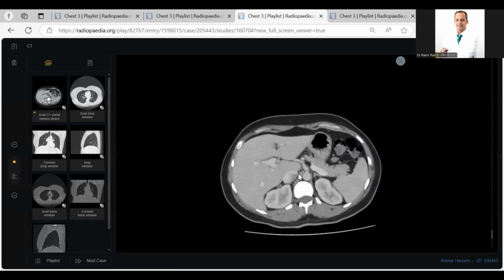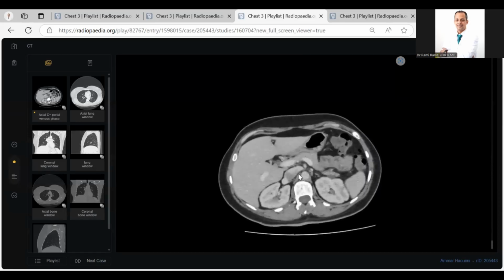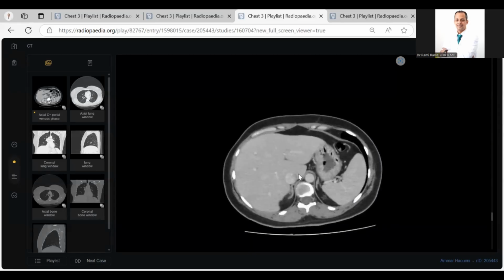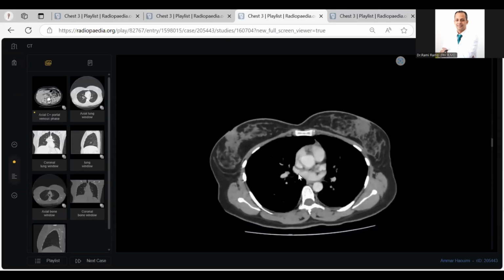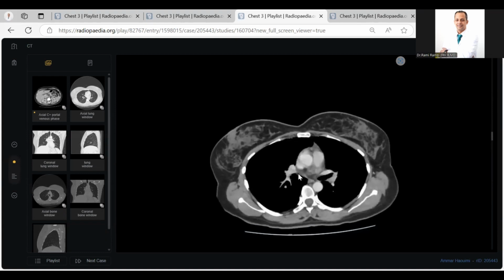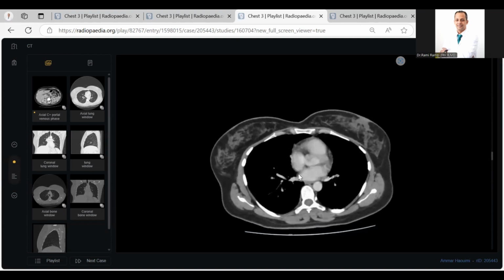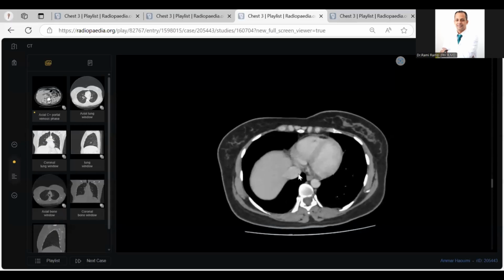What's your differential diagnosis? No pleural effusion or pneumothoraces. So multiple cysts. I think first thought would be LAM if the patient is a known case of tuberous sclerosis. If not, then I would suggest a comparison with the previous film, and also an abdominal ultrasound for associated findings.